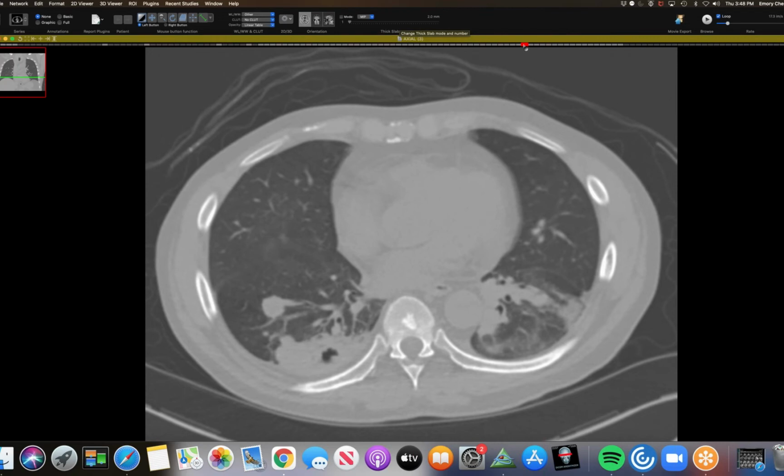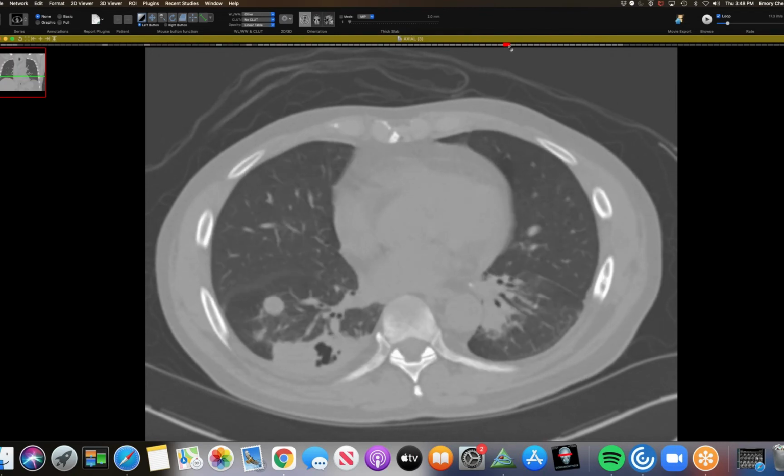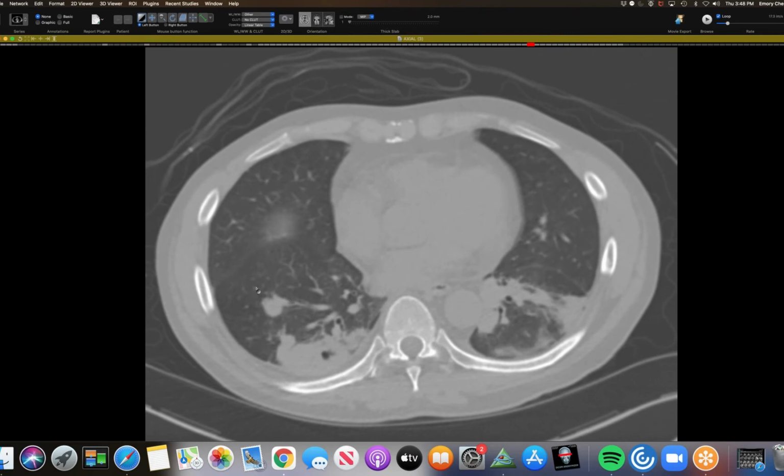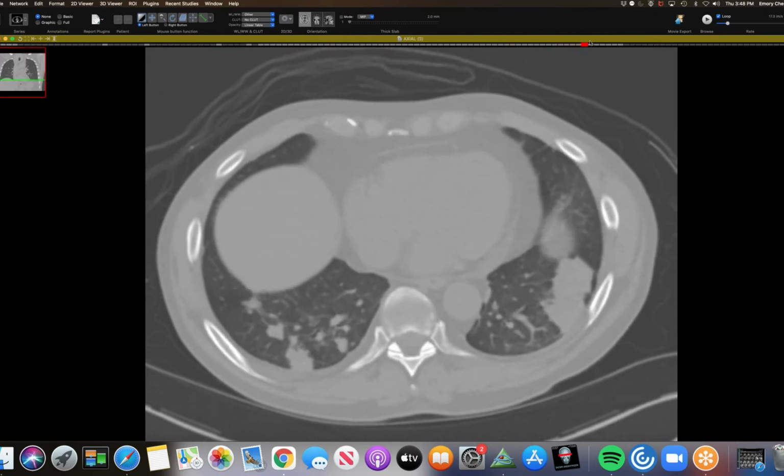Yeah, I only had one other case of crypto saved. I know you guys have showed quite a few, but I had one other case of crypto, and it was a lower lobe, and it was again kind of round nodular shape. So makes sense.